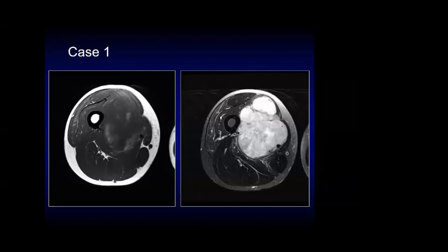I think the lesion involves the medial part of the thigh, the medial compartment. What's the name of the muscular group in the medial compartment? Vastus medialis muscle. But vastus medialis is actually in the quadriceps compartment. So we have three. This is the reason why I showed you this image.